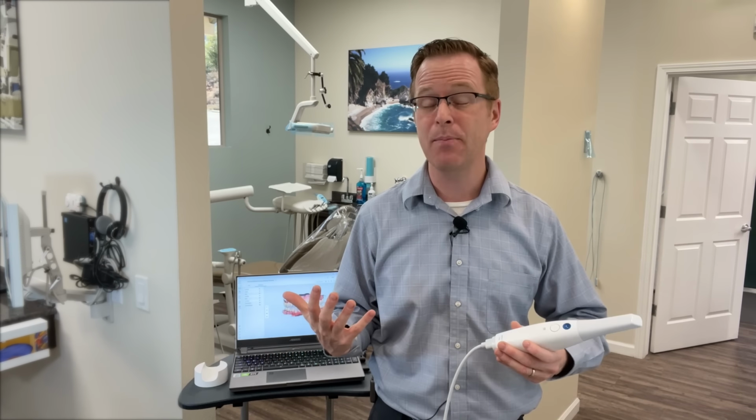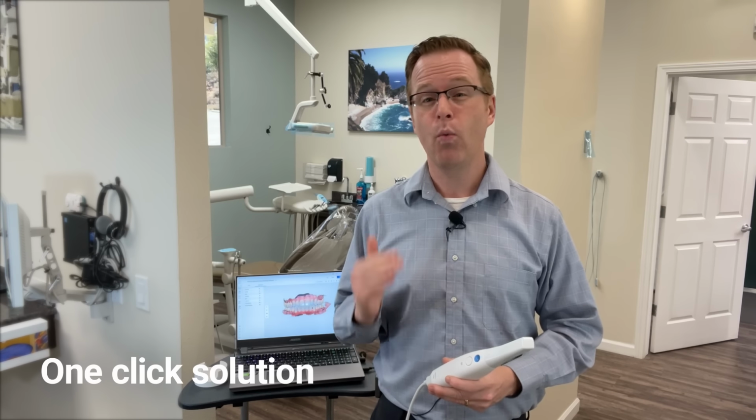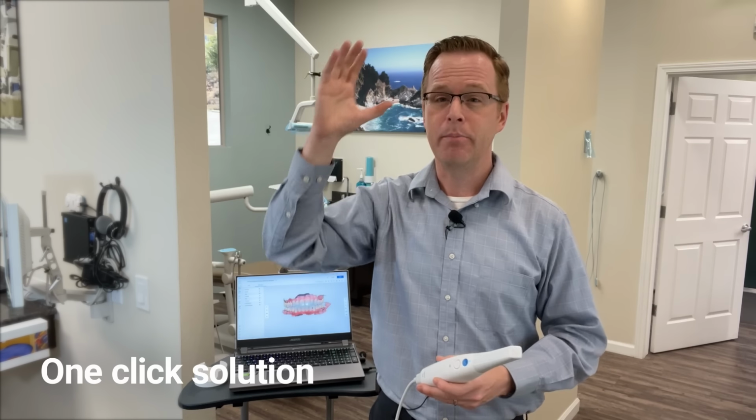Patients in the chair, how many times do I have to click just to be able to get a model for a 3D printed model, for opposing model, for a retainer model, for an Essix type retainer, for orthodontic case, for just plain old study models? What we want and what we really need in our clinical office is a one-click solution where we can scan, build the model, and then export it directly to our 3D printer in a matter of a few clicks.